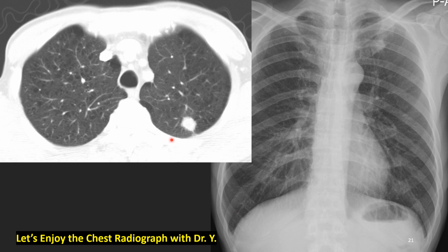This is axial CT of lung window setting. Oh my gosh, what do we find? A 1 centimeter spiculated nodule, actually proven as adenocarcinoma. We found more in his lung. Yes, emphysema, severe emphysema. He used to be a heavy smoker.